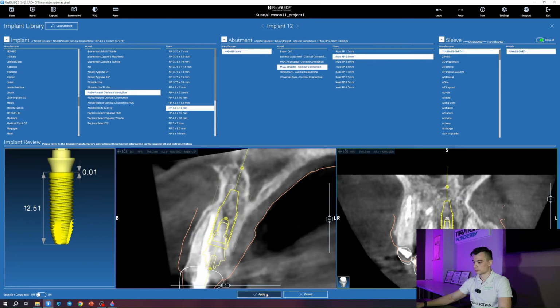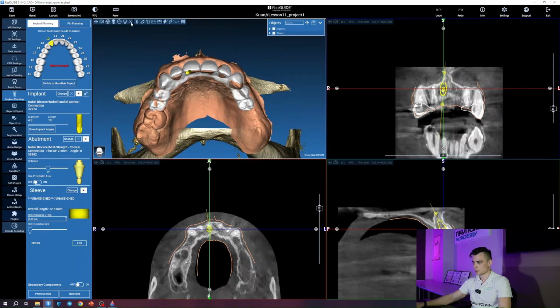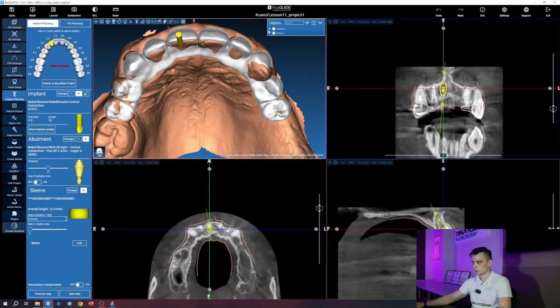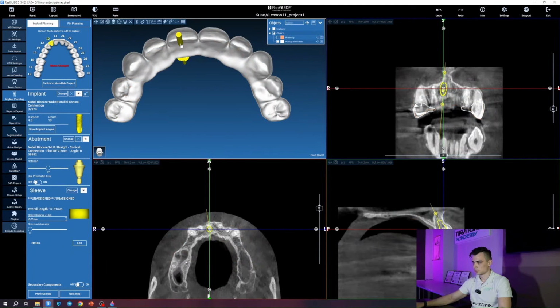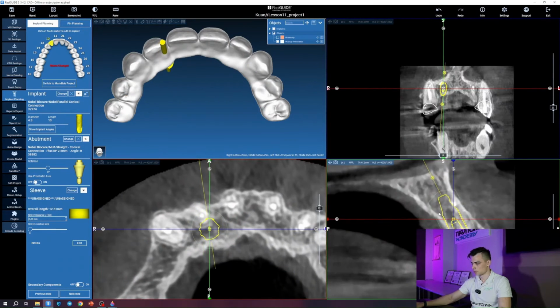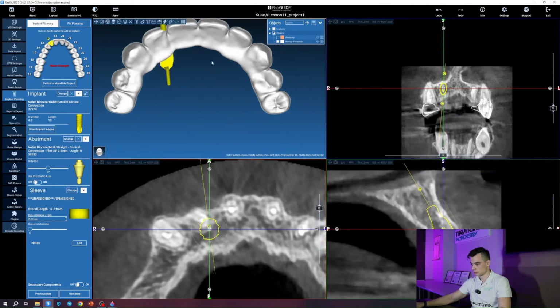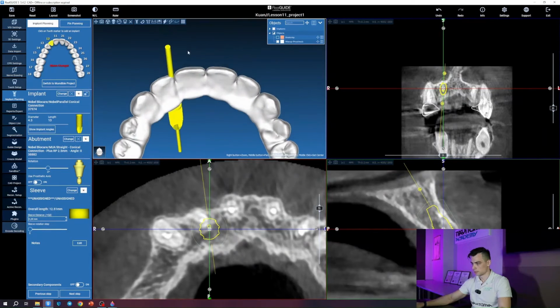We click, and everything turned out all over the place for us. All right, now let me hide this so it's a bit easier for me. For now, I'll preliminarily set it to a 2. It's coming out badly for me.